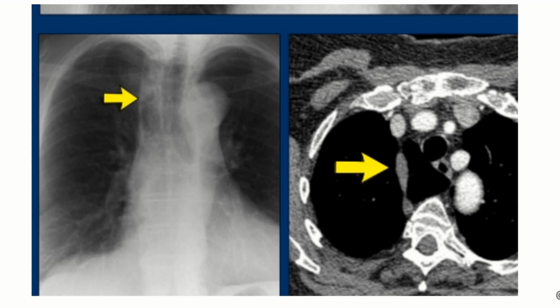It's nothing to worry about. It's just how the patient's chest looks in an X-ray. So in this X-ray, you can see this part here, and this part here they are pointing out, and this is your azygous fissure and azygous lobe, which is cutting through your right lung.